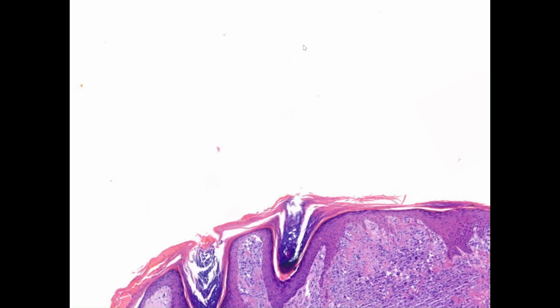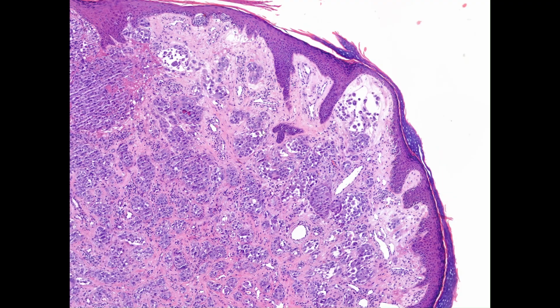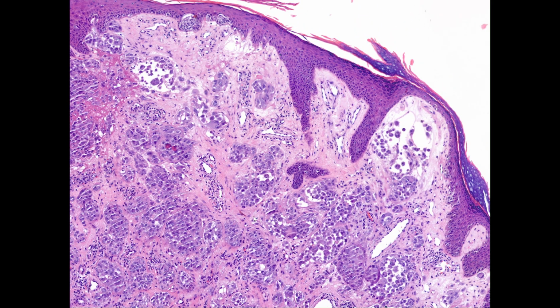So if we jump back to where we started, we can see a polypoid Spitz tumor with a pattern of perijunctional edema, and that's the morphologic configuration that we want to look for when we're making a conventional histopathologic diagnosis of Spitz melanocytoma with p16 expression loss.